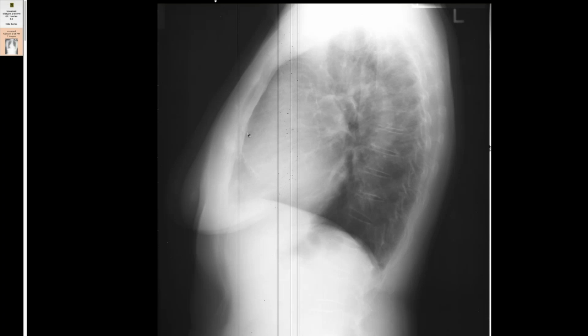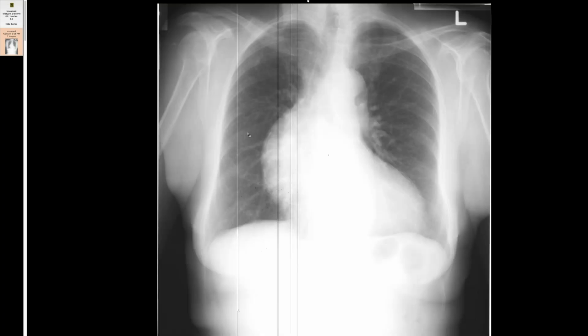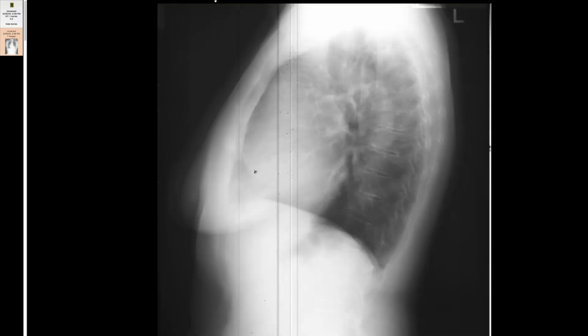And so these are some of his cases, and they're apropos of some of the ones we've been talking about. These are two cases, first of all, of syphilis with aortitis. So this is the traditional syphilitic ascending aortic dilation or aneurysm that involves pathologically heavy atherosclerosis. So you see this calcification of the ascending aorta here in this aneurysm. And here's the lateral view with the calcification in the rim of this very dilated ascending aorta.